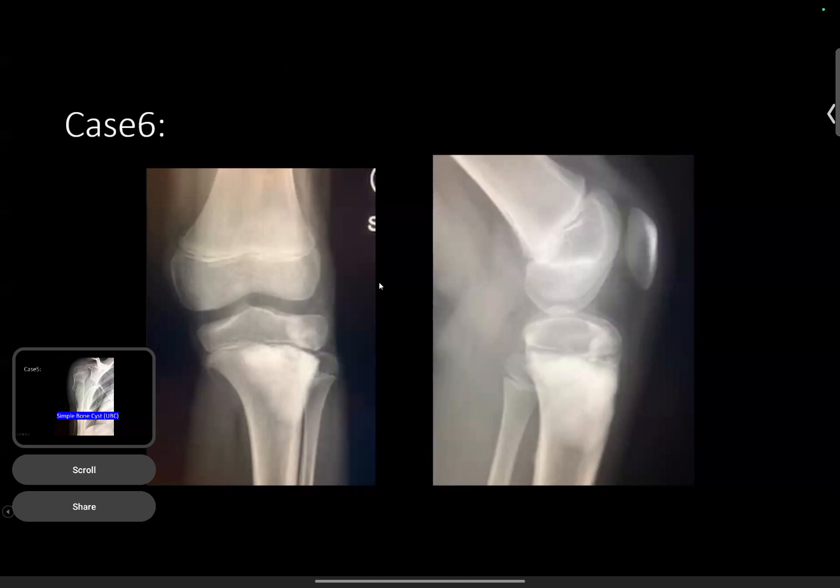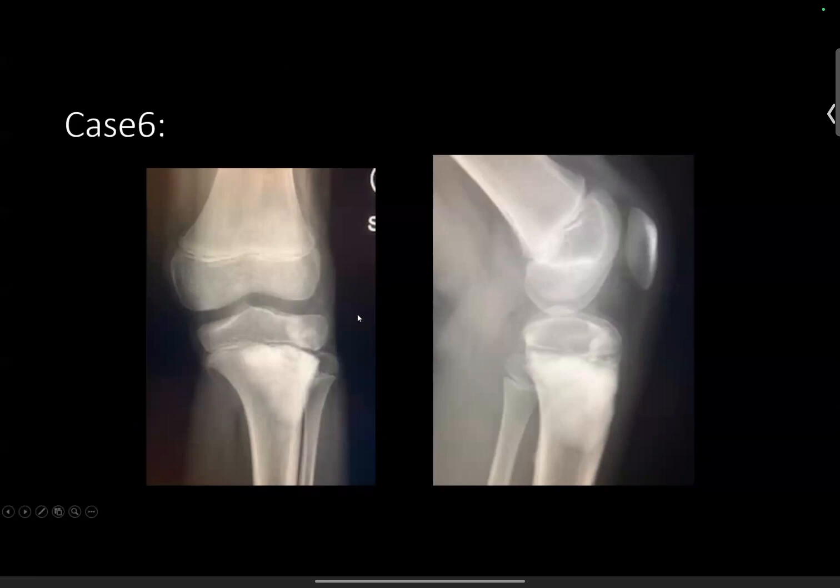This is a sclerotic lesion, so we've talked about the density. And now we're going to talk about the margin. The margin is not really well defined. We see areas going into the epiphysis, kind of looks blurry on the side. This is very concerning. This is osteosarcoma. Okay? So someone said Brodie's abscess. That would not look like a dense sclerotic lesion.